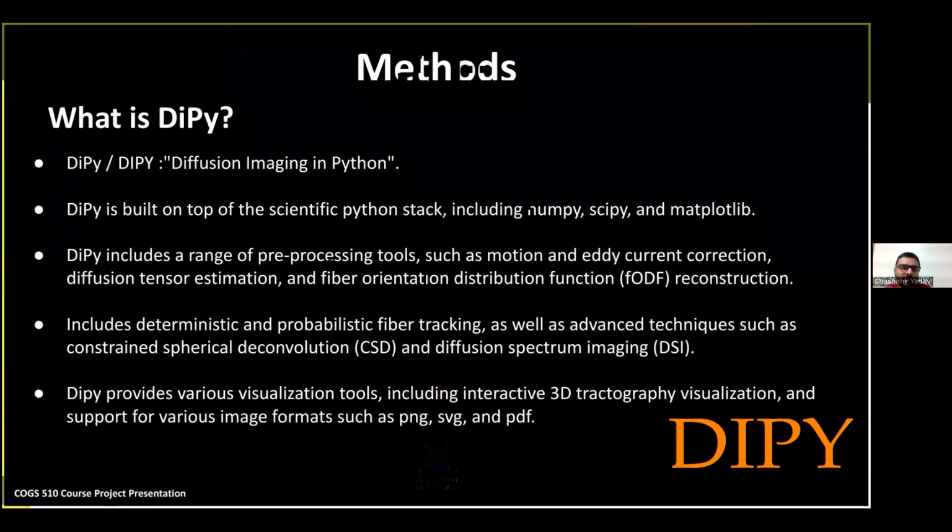So this was all about the processing, but what after processing? DiPy also has a lot of visualization tools, which we'll look at in the tutorial, like how you can visualize a tract and export to different formats such as PNG and SVG. You can even export the whole tractography: using the algorithm, you can export the tractography in a TRK format, and then utilize other tools to visualize it if you don't want to use DiPy for visualization.